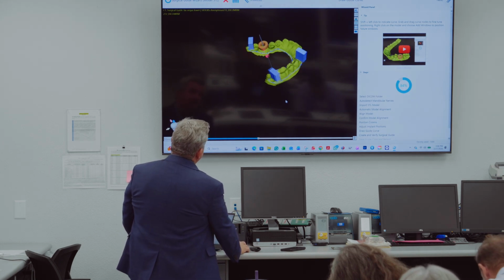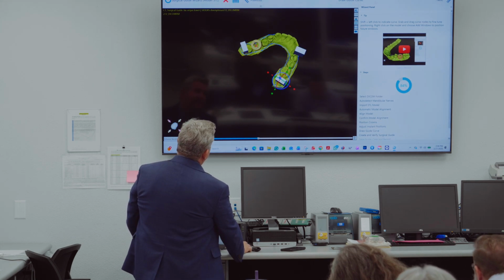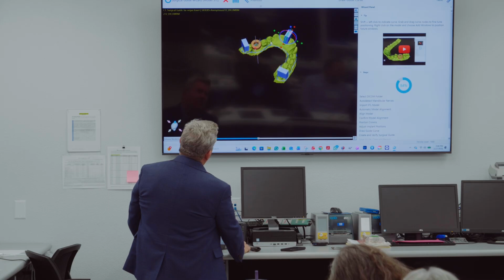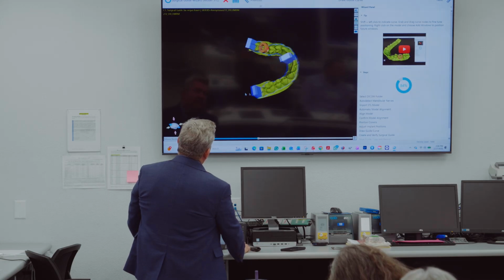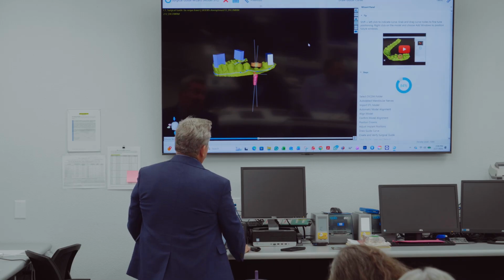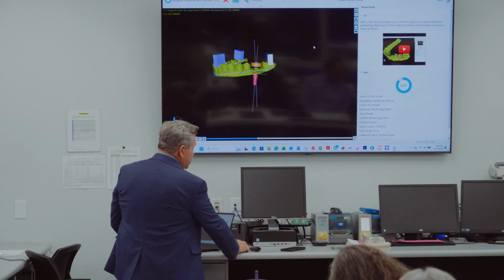Okay, so you get some windows. Actually, I don't like that one. I like this one. I'm going to move this one over here. So this one does need to move. I'll move there, put him there. That way we can see the whole arch. Okay, something like that. So we're done. The only thing you do now is click next.